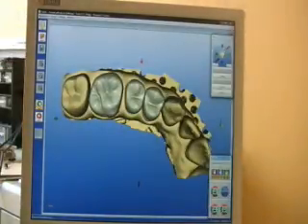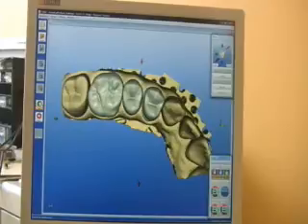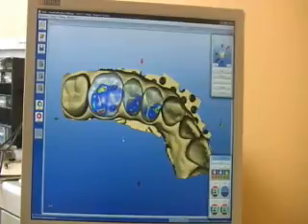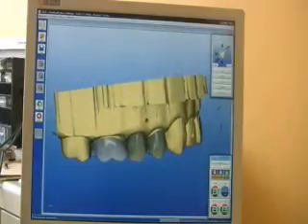The biogeneric does a pretty good job at locating the proposals in the correct plane. The 3.8 software in general is much quicker than the 3.6 design process. Once it has completed all three proposals and made some manipulations, you'll see how the occlusion pops up. Occlusion on the molar is a little bit heavy, but this model is under prepped.